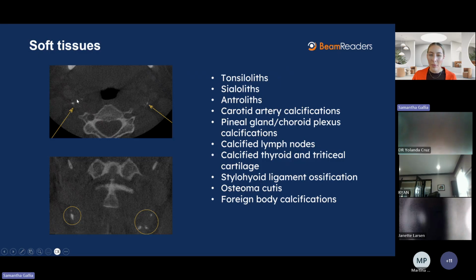Sometimes they look like rings, but sometimes they're not really fully continuous rings. They can be a little spotty like this. And they usually happen around the area of C3 or C4. So if you have the cervical spine imaged in that scan, you can use that to tell where you're at and localize these calcifications. So that's an example of those.